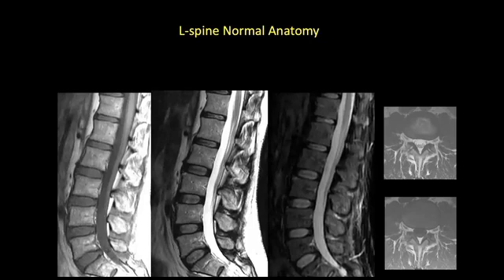And then in terms of axial images, some places use T1s and T2s. I think the T2 weighted axial images are more revealing, especially for disc pathology. The issue becomes, do you do them at every disc level or do you do them in a stack? When we talk about disc herniations, the American College of Radiology recommends you do at least one series parallel to the intervertebral disc that you're interested in to best identify the contour abnormalities.